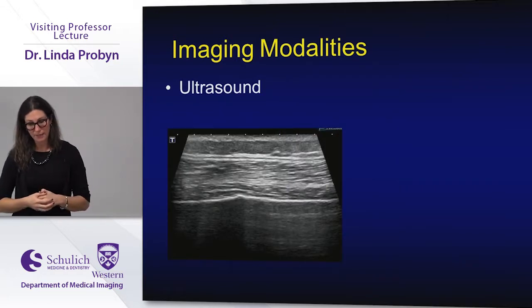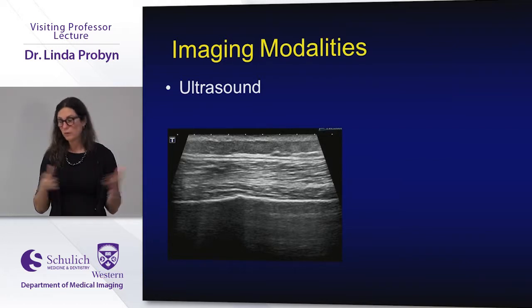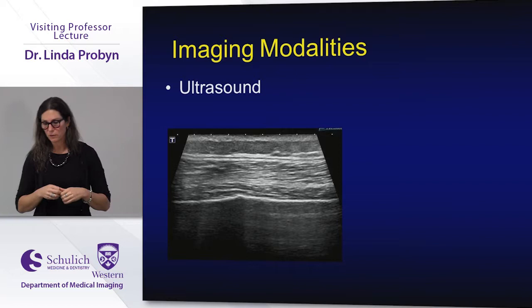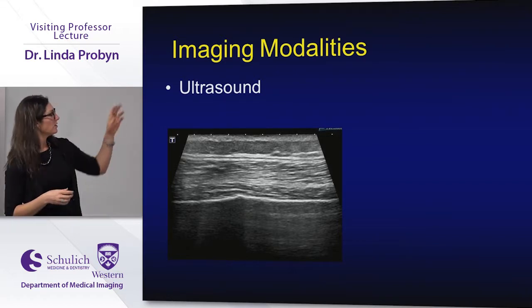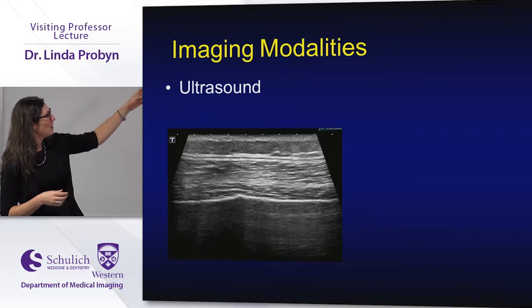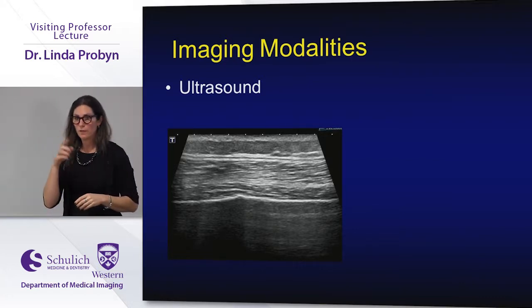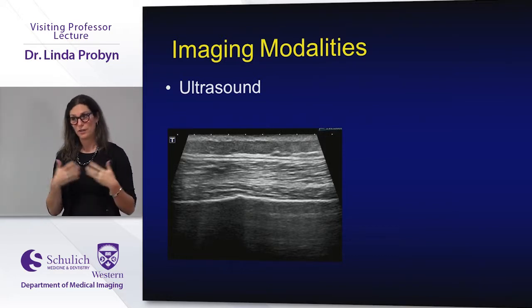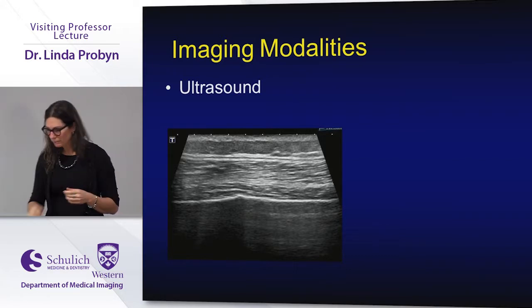So here's a case that came in to me. I was on ultrasound, and it was to rule out a quads tear. And so I'm looking around. It was a 78-year-old man, and I was looking around, couldn't find anything. And then I just sort of decreased my focal zone, and I looked and I go, okay, that's a little bump on the femur. And so it was nice because the patient was right there. I said, are you on bisphosphonates? Yes. I said, okay, let's get an X-ray.